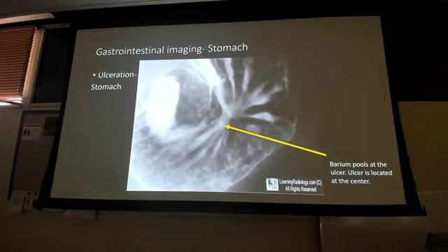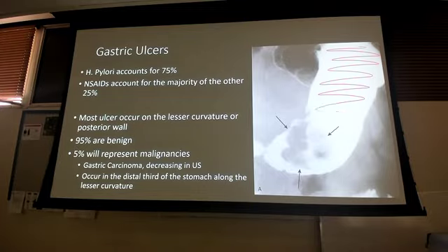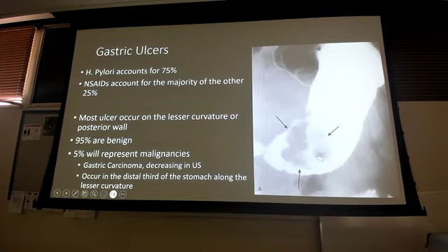Another way to see an ulcer is when you get pictures where the entire stomach, they've given them so much barium, the entire stomach is coated. I don't have any rugae here, okay? But look at all this barium. That's way more barium than we've seen. So they drank more barium, probably because they're getting ready to do what's called a small bowel follow-through, which is basically an evaluation of the small bowel. And so they make them drink a lot of the barium because they've got to get it to go through all of that intestine. And they take pictures of that.